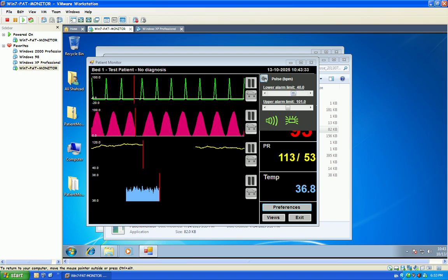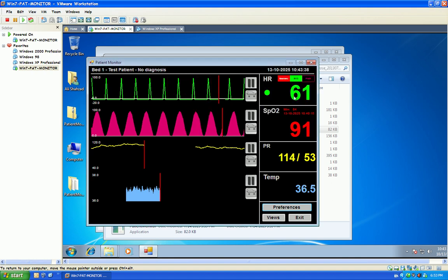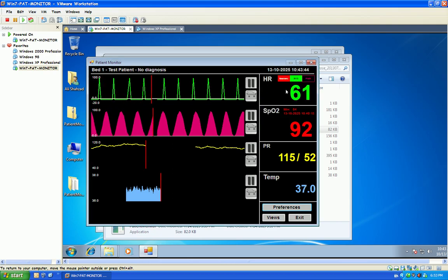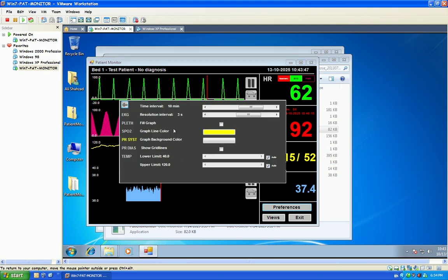40.0. This one. Now, when you uncheck this, it no longer stops blinking. If you recheck this, it will start blinking. Now, we need to change the waveform. You just go ahead and click on whichever you like.